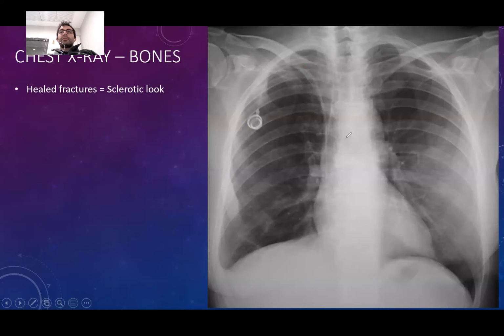It has a mastectomy and it has a sclerotic costal lesion. So this is probably some metastasis, because breast metastases usually are sclerotic metastases, and the patient has gone under operation and is receiving chemotherapy right now. So looking at the chest X-ray, you can sometimes gather things together and make up the whole story, right?